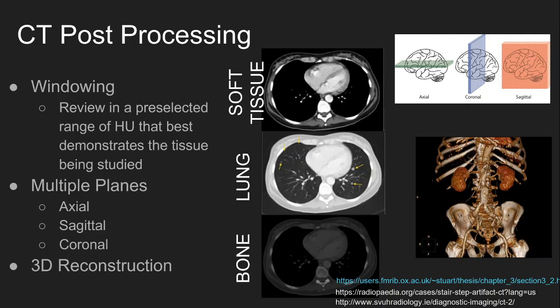This allows us to visualize different organ-specific pathologies that would otherwise be missed. For example, the lung window always should be used for thorough inspection of the bronchioles. However, if you tried to review the ribs without changing to the bone window, you might miss a fracture. In real life, this is like changing the brightness and contrast on your TV.